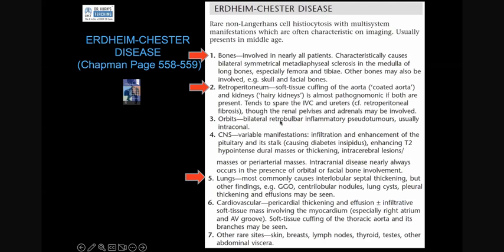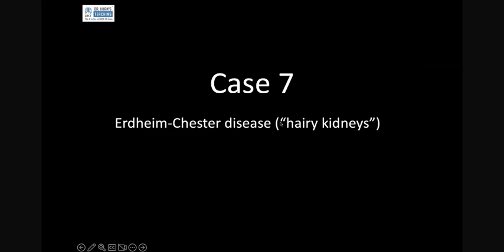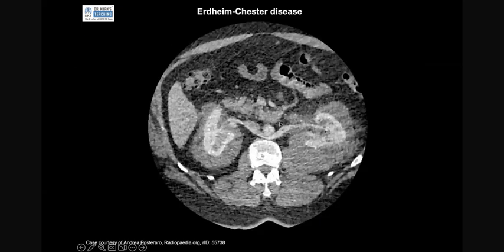So these are the manifestations of this. These are a few cases from Radiopaedia. So this is one example from Radiopaedia, quite unique. Please remember your thought process was good. Lymphoma and any hematomas surrounding the kidneys, but again, subcapsular, but this one was different.